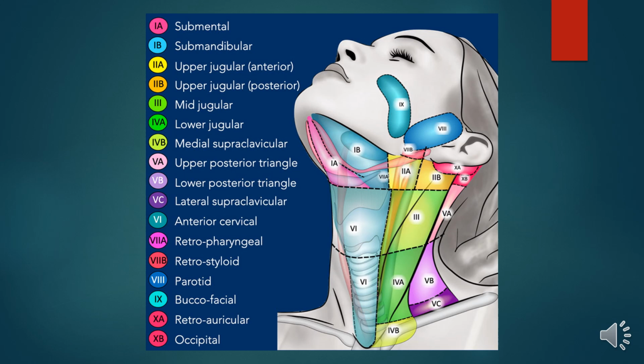So in this image, what we see is level 1, 2, 3, 4, 5 and 6. Now we'll discuss the lymph nodes at levels 7, 8, 9 and 10. Level 7 lymph nodes cannot be seen through surface marking during sonography because they are deeply situated in the neck at the retropharyngeal space, entirely at the level of the pharynx. It is located posterior to that. So the entire length is level 7, which can be seen only on CT or MRI, not on sonography.